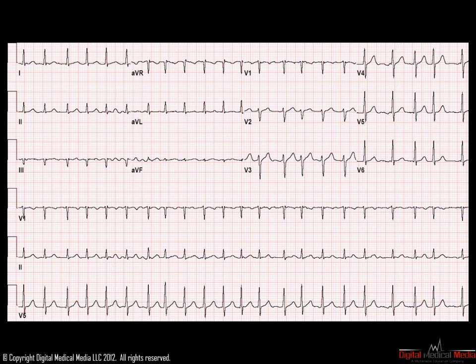It is important to note that the faster the ventricular response becomes, the harder it is to identify the irregularities in the R-to-R interval. This happens because as the heart rate becomes faster and faster, the irregularities become smaller and smaller. When the heart rate is controlled with atrial fibrillation, the irregularities are wide and can be easily seen with the naked eye. As the heart rate increases, the irregularities may be more difficult to detect with the eye, but are easily noted with calipers.